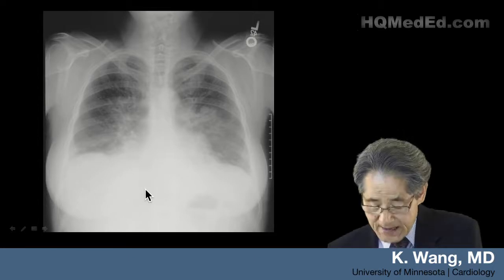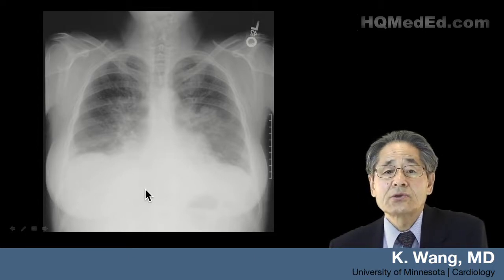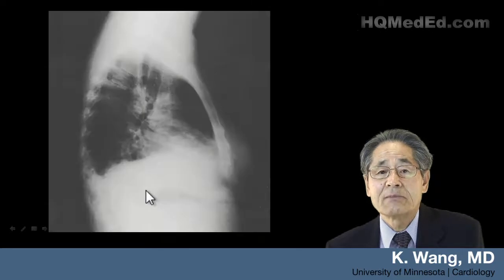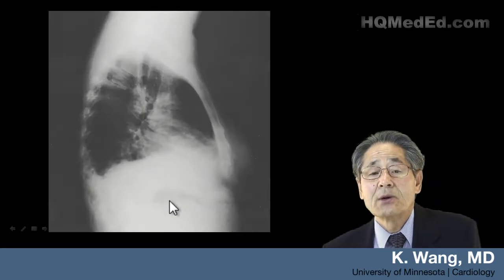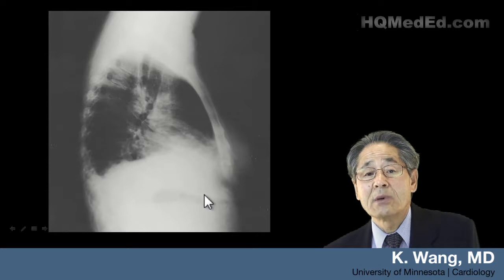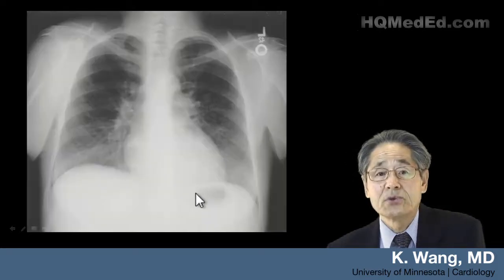the costophrenic angle. Just to allow you to appreciate how normally the gas bubble in the stomach and the diaphragm is located, well, this is the lateral X-ray of that same patient, again allowing us to appreciate the gas bubble in the stomach is here, while diaphragm should be right above it, but this is all fluid, subpulmonic effusion.